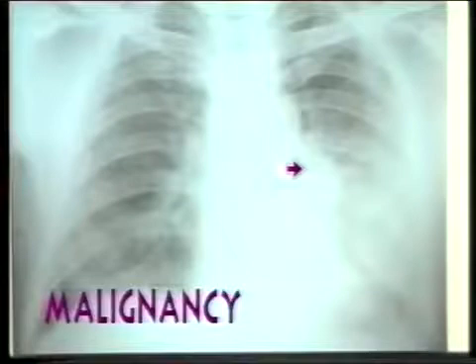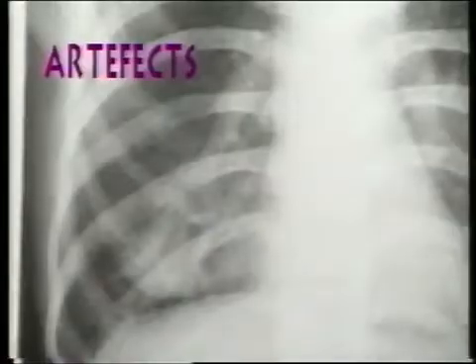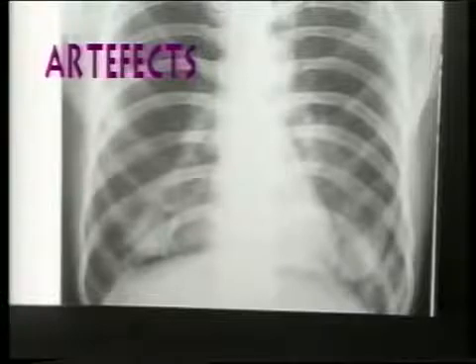Particularly, if there is a collapse associated with consolidation, bronchoscopy must be done to rule out bronchogenic carcinoma. Note again the uniform opacity of the lower lobe and dense opacity at the hilum. While evaluating consolidation, certain artifacts must be considered. Note the uniform opacity in the left lower zone. If you observe closely, a similar less dense opacity is seen on the right side. This is a soft tissue shadow of the breast.